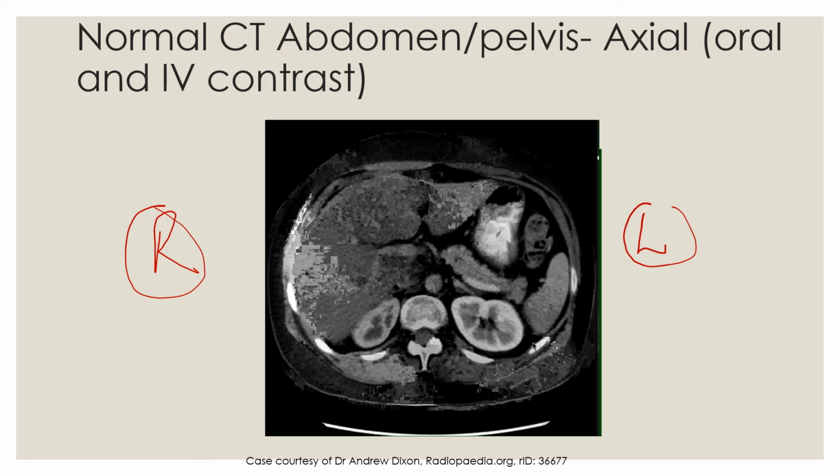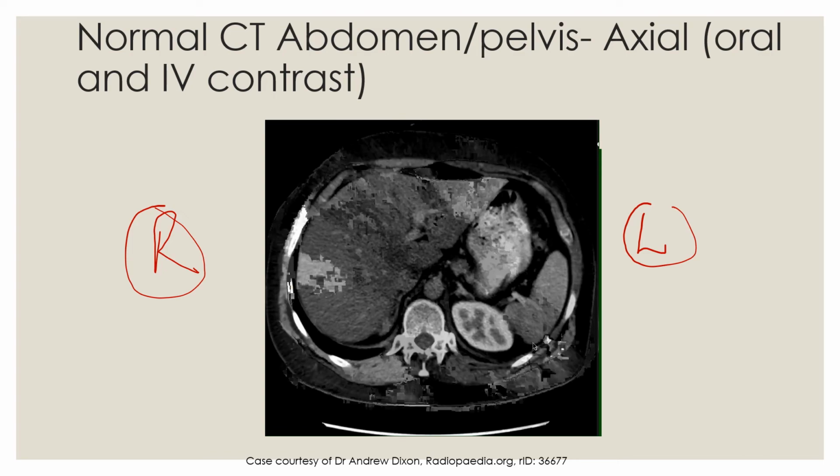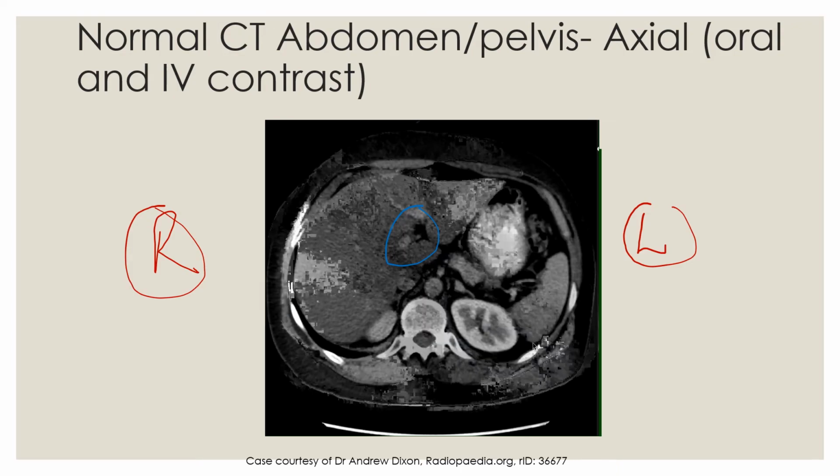So I'm showing you the right anterior and posterior portal veins there. If you can't see, the right posterior will be coming here and the right anterior will be coming there. And I'm just going to go and follow the left. So here is our left. The left is going to be in that contour. I'm just going to scroll again, just see if you can see that. Great. So that's your liver.